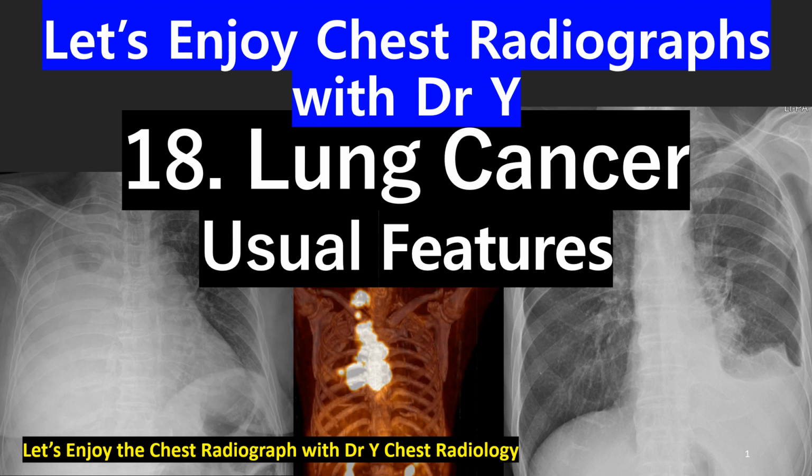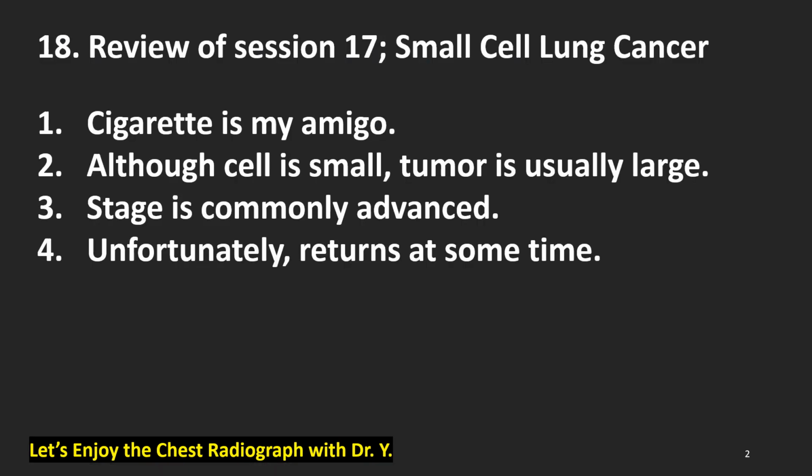Today's topic is lung cancer, the usual, everyday, common features of lung cancer, session 18. Before entering session 18, let's review session 17, small cell lung cancer.